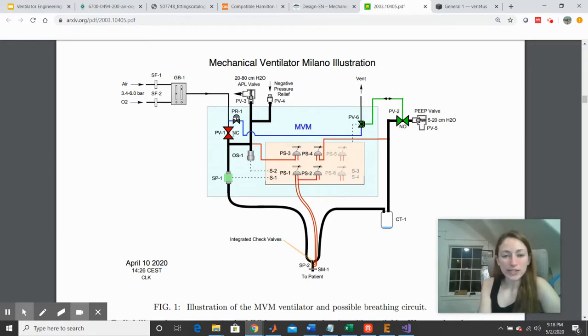However, I do notice that this has the indication that it is NC, normally closed. So in the event of a mechanical failure, this valve is going to fail closed, which is probably good because the gas supply is coming right into here. Whereas this one at the expiratory end is normally open, NO, which is probably a good safety procedure if we have some other mechanisms built in to enable the patient to continue breathing, assuming that they're able to breathe on their own to some extent.